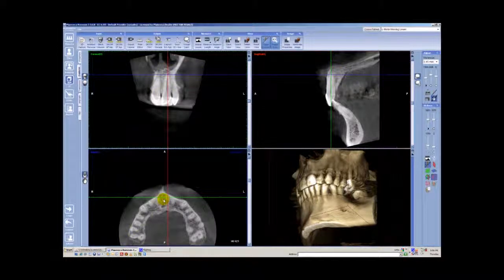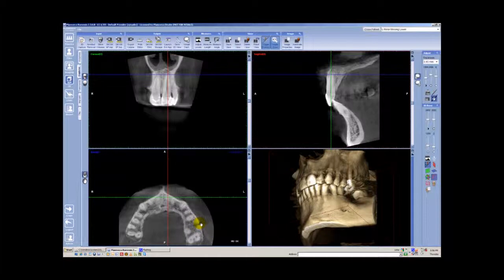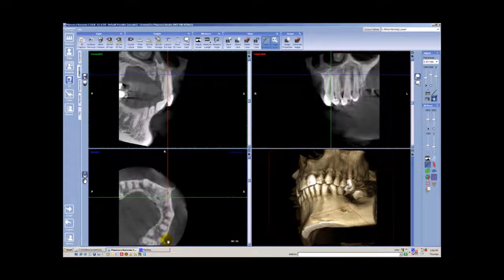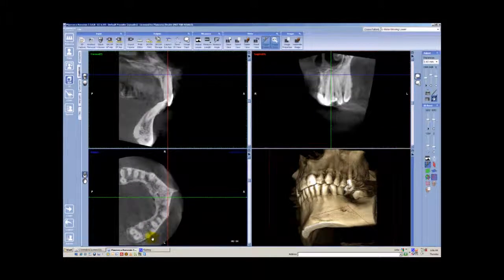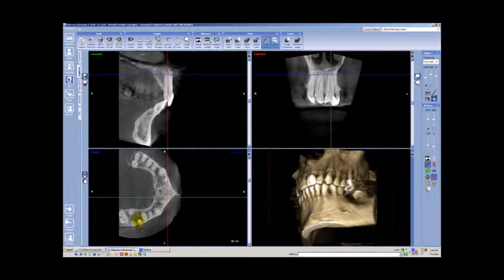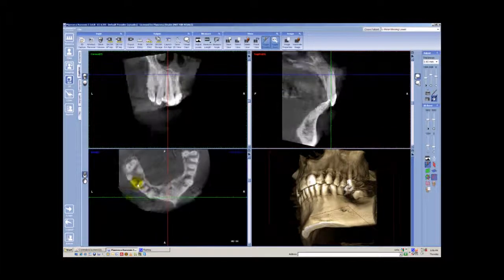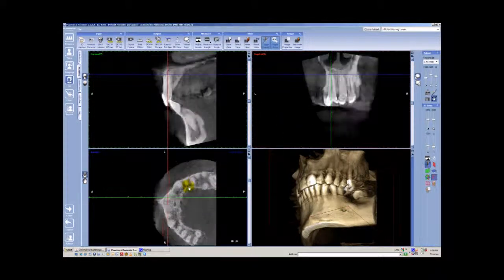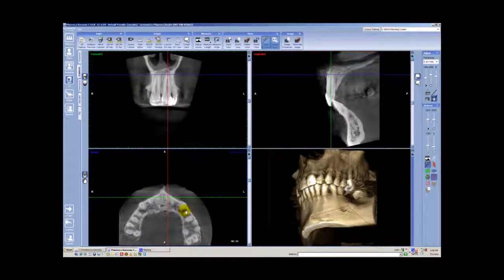Now what I'm going to do is come to the axial view, do a right mouse click, and now I can rotate right around that and pivot right on that root tip, 360 degrees around, keeping the root tip in perfect clarity, perfect view, 360-degree view all the way around. So it's a very easy, very quick way to do assessments in the Explorer window since you have all three slice planes. And it's basically just that easy.